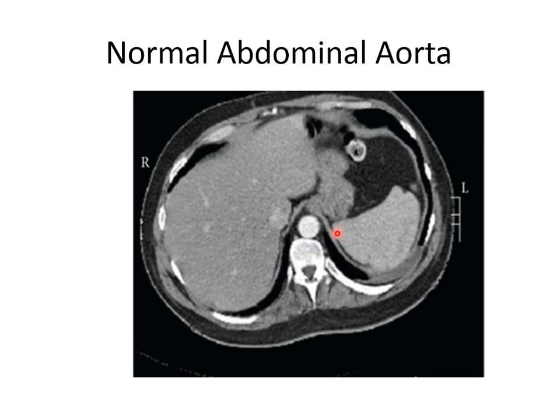This is a normal abdominal aorta. Its diameter is not more than 2 cm, but for an aneurysm to be diagnosed it should be more than 3 cm. Regular wall. No ulceration, no surrounding soft tissue thickening, no perivascular gas, and no wall thickening. Just to see the normal.